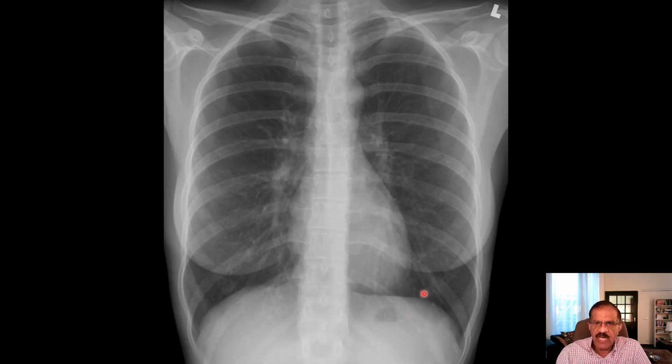This is another X-ray chest. This is the L. L means this is the left side, and you can see the spinous processes, and you can appreciate the medial end of both clavicles. Since the distance between the medial end of the clavicle on the right side and the spinous process is the same as that on the left side, this patient is not rotated, and the trachea does appear in the central part, that's in the center, and you appreciate both clavicles. I think in this X-ray, I was trying to explain to you how to count ribs.